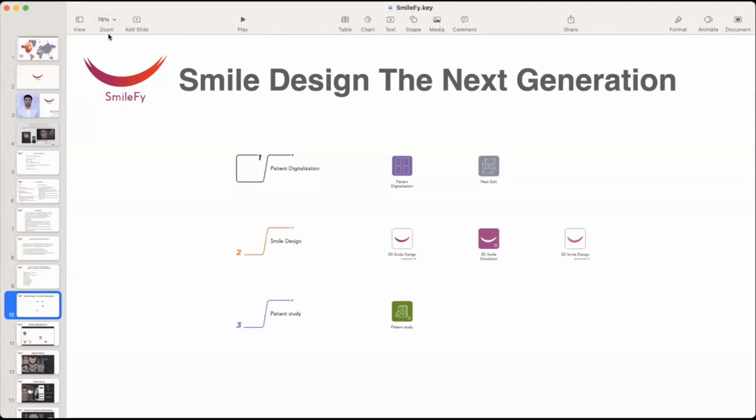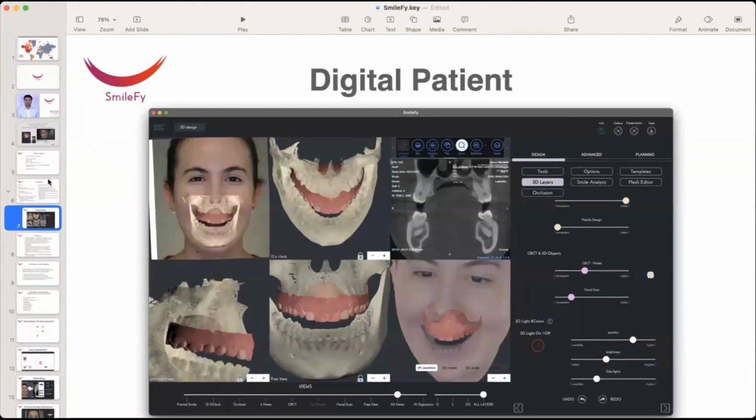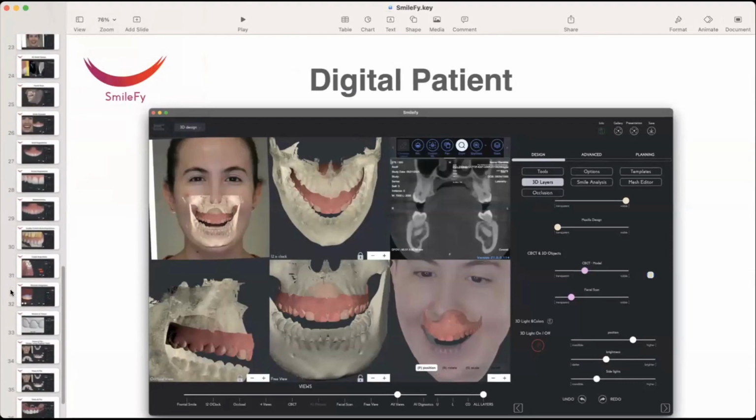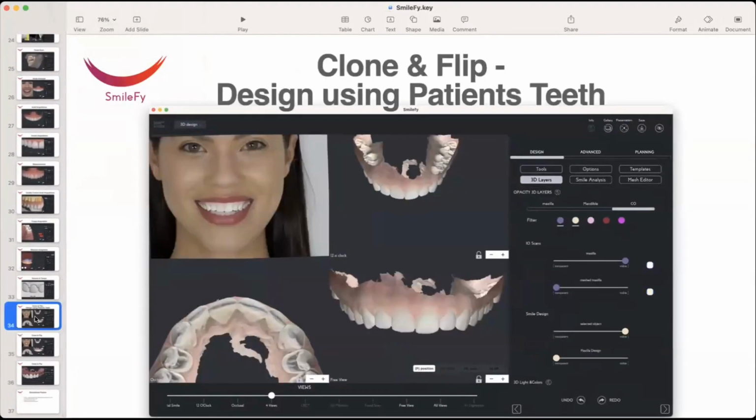Now, also for a little bit more advanced users, what I realized, when we segment the teeth automatically at the beginning, we can offer you the option, and that's something new, and I just realized it's very, very interesting.